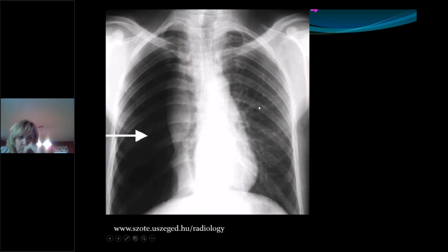And in case you didn't have enough pneumothorax, we gave a guy one on the other side. So here is the lung. Here is all air. You don't see any markings at all because there's nothing here. There's nothing but air in here. So when a person gets a chest tube here, it decompresses the intrathoracic cage, and then this lung will re-expand. Life is good, as opposed to all the pulmonary vasculature markings that you see on the left side.